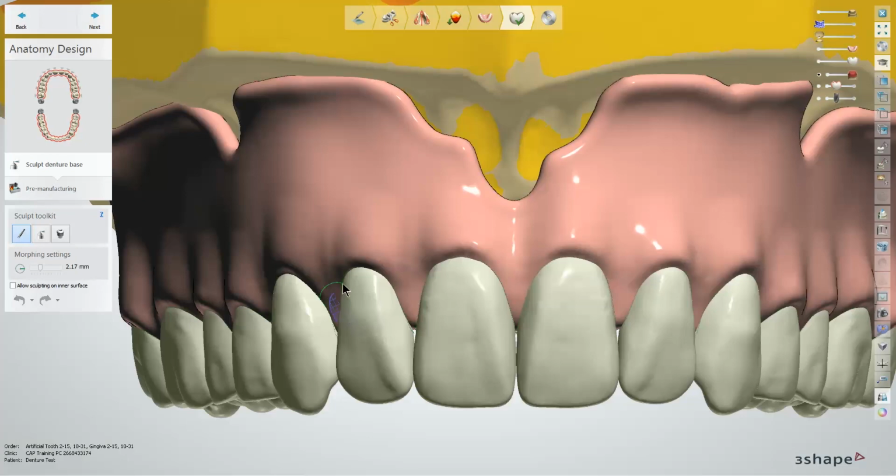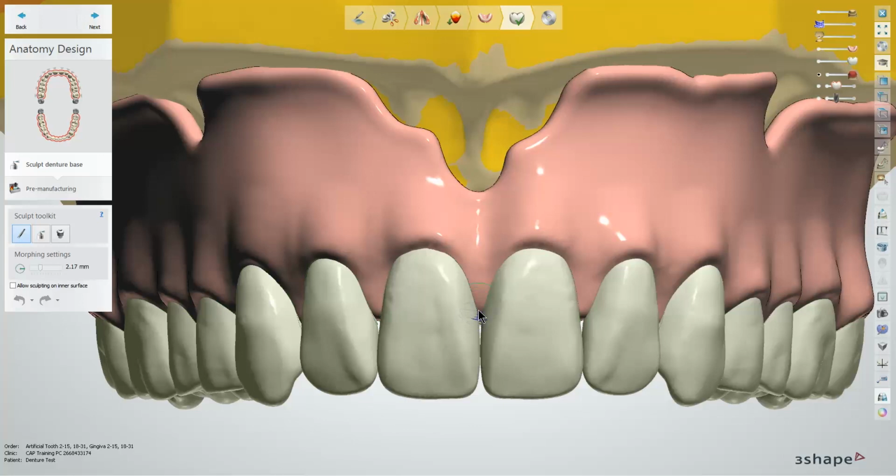By this point, you may have noticed the green lines that are on all of the teeth based on the library. This is a predefined edge that the software is automatically bringing the tissue to. So usually this default tissue shape is pretty good on its own.